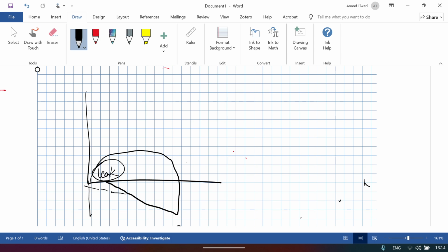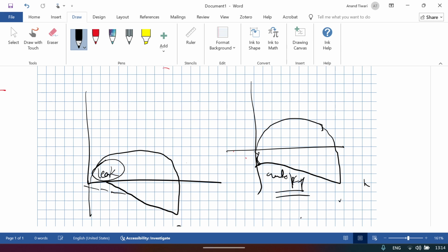A significant amount of leak can be picked up from the flow-volume loop. And if you see inspiration, flow-volume, and expiration touching here, this is the amount of autoPEEP. AutoPEEP can also be picked up from the shape of your flow-volume loop.